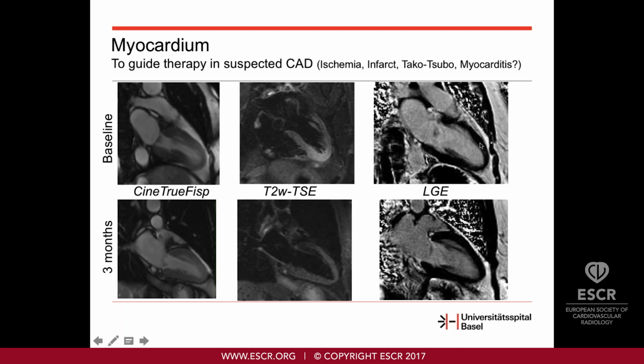So this might be signs of an acute coronary syndrome. However, we did coronary angiography, and there was no evidence of coronary stenosis. MRI showed diffuse wall motion abnormalities, diffuse hypokinesia of the left ventricle, some pericardial effusion, and here also we see this hypokinesia in the anterior wall, in the inferior wall, and again this pericardial effusion.